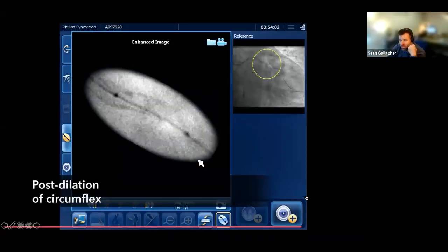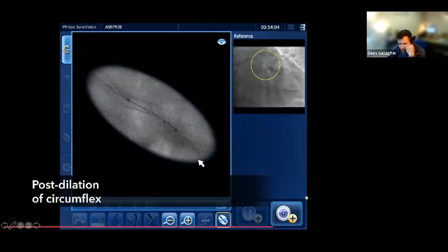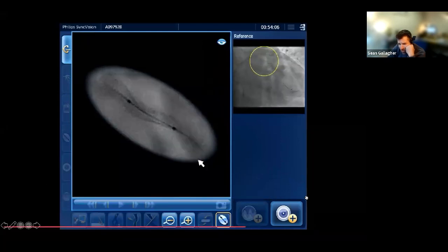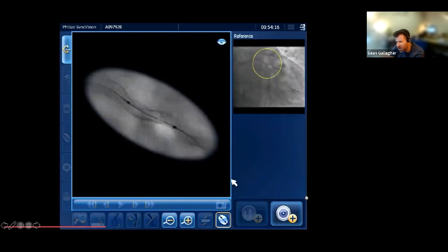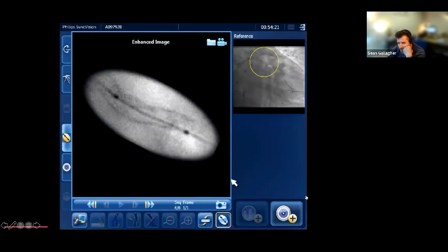I think that's an important point though, Andrew, that knowing your stent platforms when you're stenting from circ or LAD back into left main, and what size stent you're going to take and what you're going to be able to post-dilate it up to. So I think this was a 3.5, which means we're safely going to be able to go up to, with most stent technologies, somewhere between 5.5 and 5.8. So we should be able to POT in the left main.